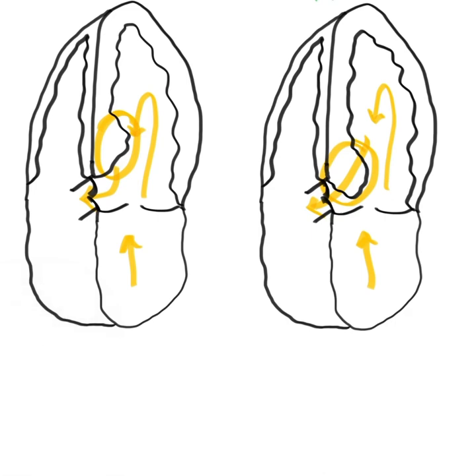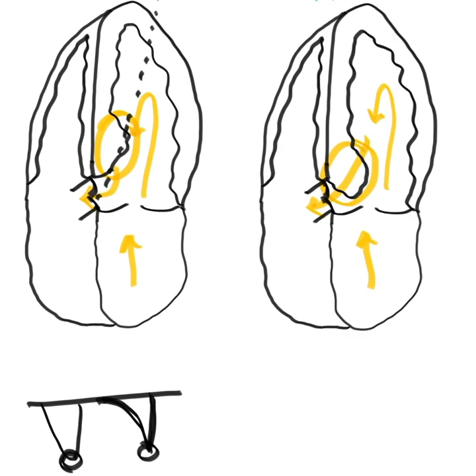And so when you throw your continuous wave Doppler through your aortic valve, your normal waveform is going to look like this, right? But in a patient with HOCM or HCM, either one, you're going to get what we call a dynamic gradient. And that's this dagger-shaped waveform here. And it's what we call a late peaking waveform, because instead of it peaking right in the middle of systole, it peaks at late systole.